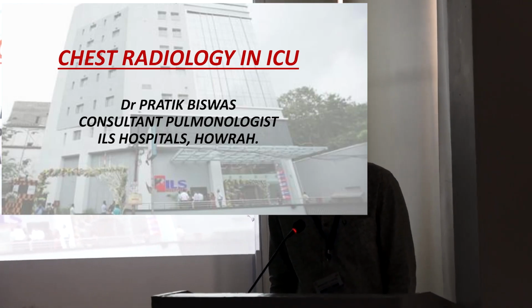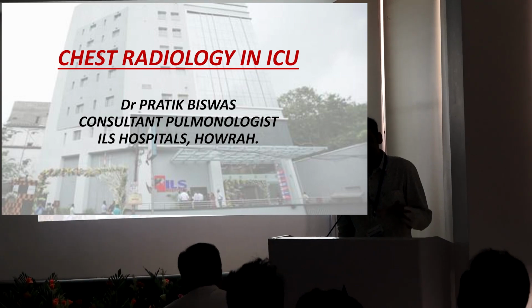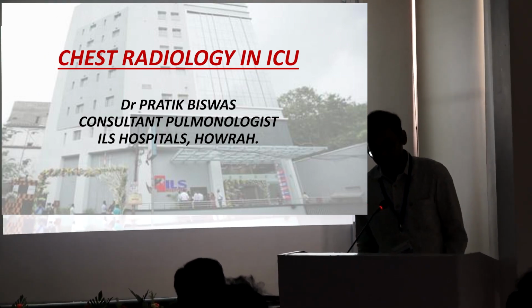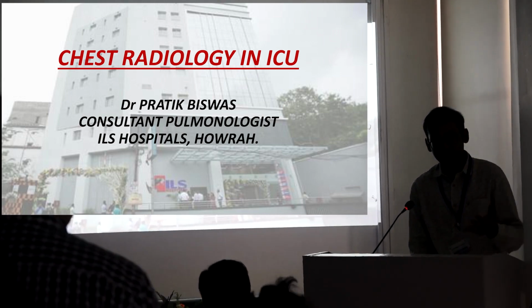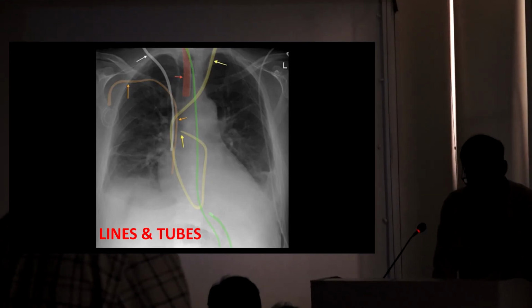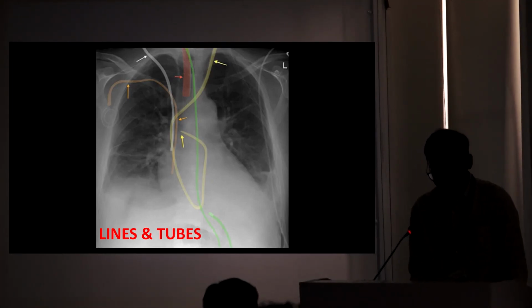I'll be mainly discussing X-rays in ICU and I'll be showing relevant CTs. Since this is a workshop, I request everyone to participate so we can have one-on-one interaction with every case I show. Okay, so please volunteer yourself. I'll start off with lines and tubes in ICU.